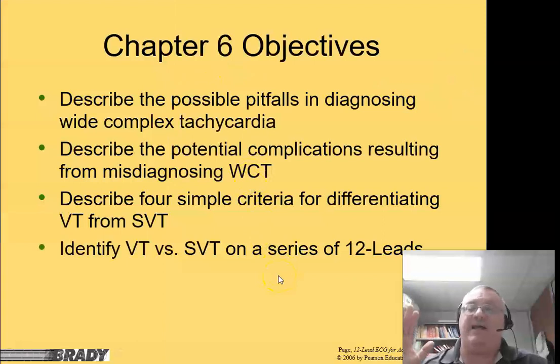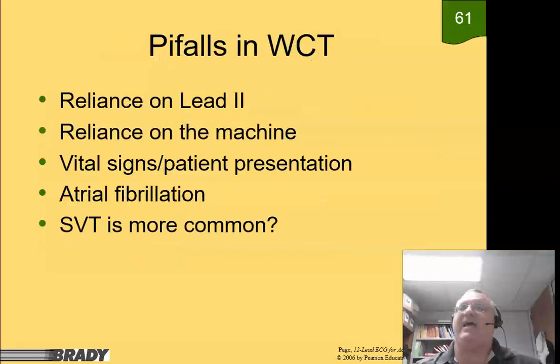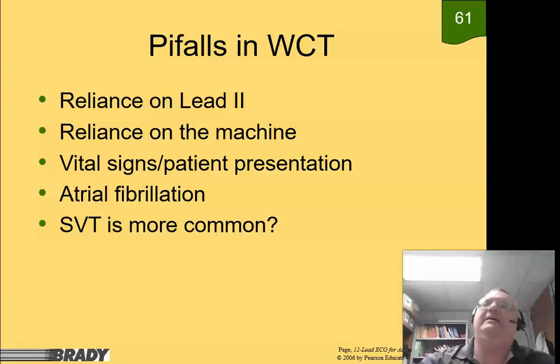How to identify VTAC from SVT. That's the real reason that we're doing this. Misdiagnosing wide complex tachycardia can cause some major issues. The pitfall is that we rely on lead 2, but for telling whether or not you've got ventricular tachycardia, lead 2 is probably the worst lead that you could possibly use.